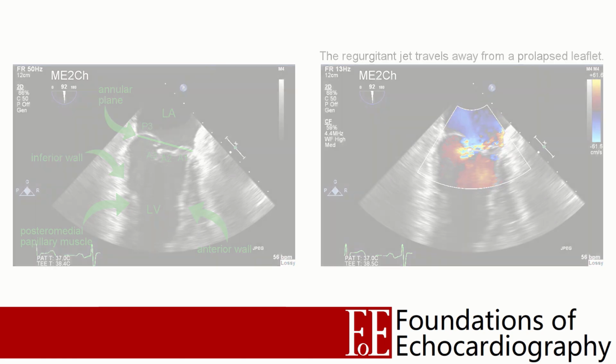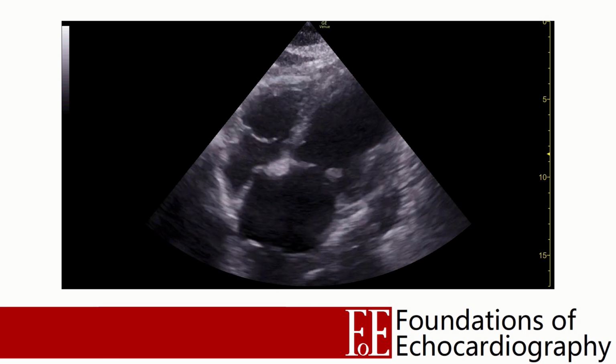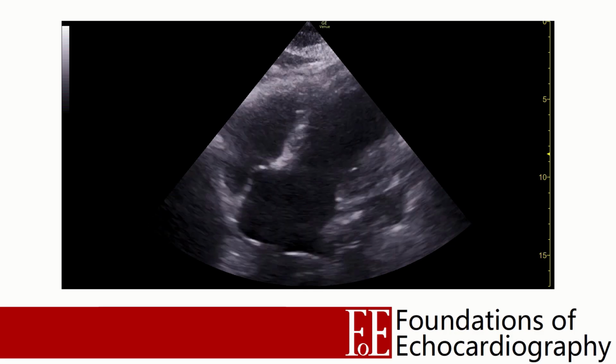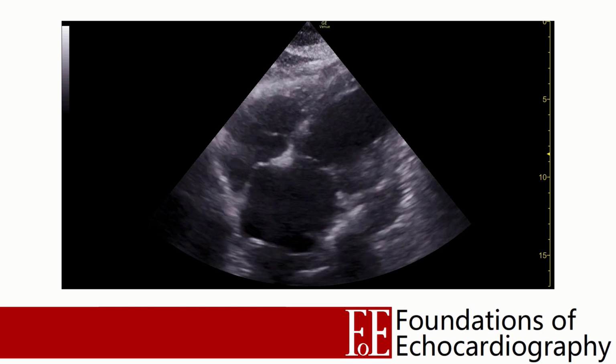Alright, so let's wrap up these examples of MR with one final case study. These clips are taken from an elderly lady who presented in respiratory extremis, having had progressive shortness of breath over about 4 days. She required intubation immediately on presentation to the ED, and this lady was a smoker with a history of COPD, so she had no parasternal windows to speak of.